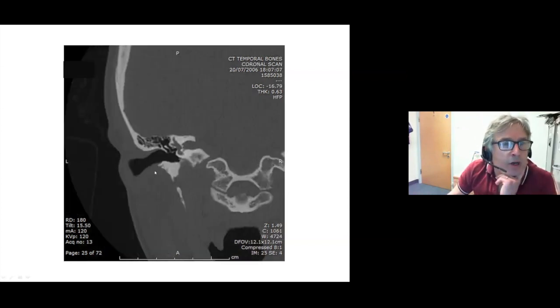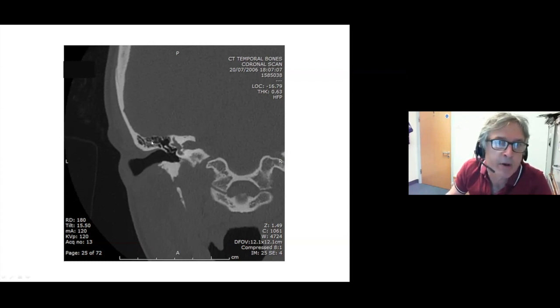If we look at a coronal image of the external canal, again we expect to see nicely defined bony structures. I think this is one area where normal variation is quite important, particularly with respect to the structures above the roof. Sometimes you get a whole sack of pneumatized mastoid air cells here and a relatively thick wodge of bone between the intracranial compartment and the external canal, but sometimes you get no aeration and just a relatively thin plate of bone. And this obviously has implications if you're thinking about drilling into this area. I think go easy would be the watchword.